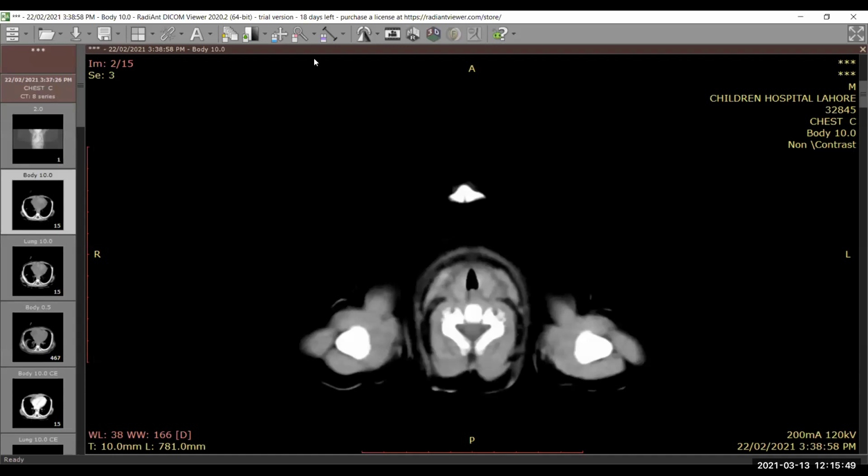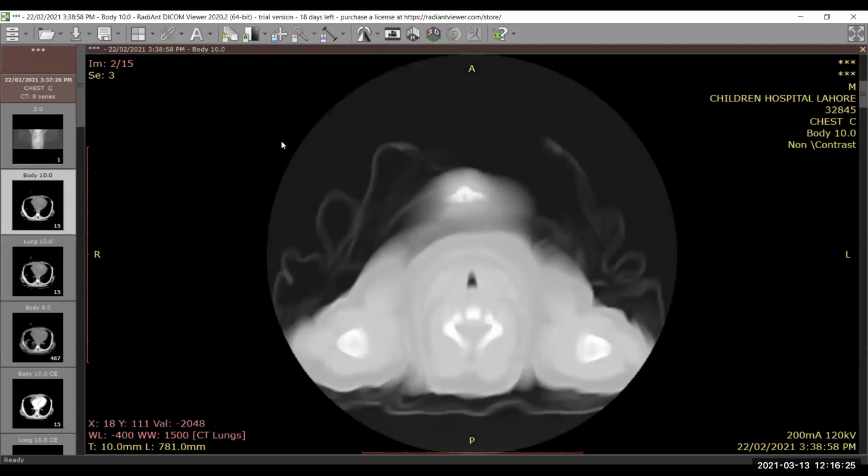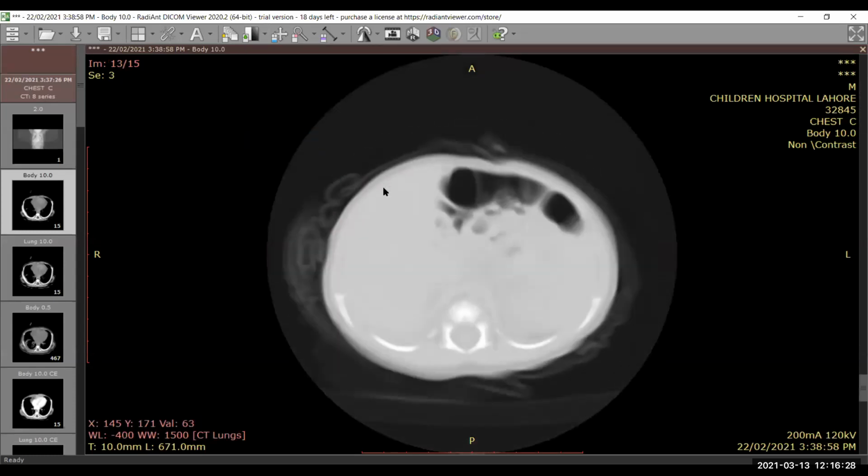Wait, let me put the lung window for you. Okay, sorry for the delay. Yes, no problem. I scroll through?